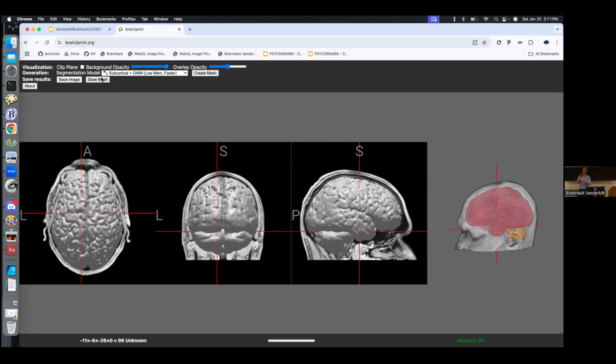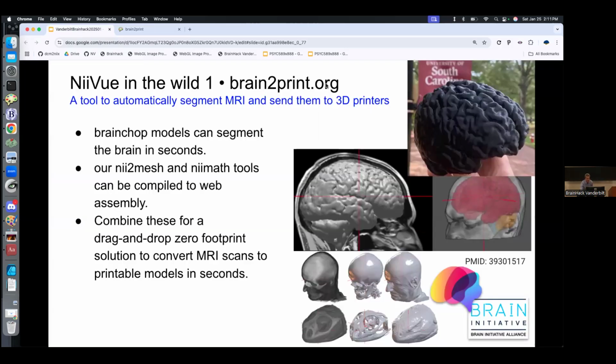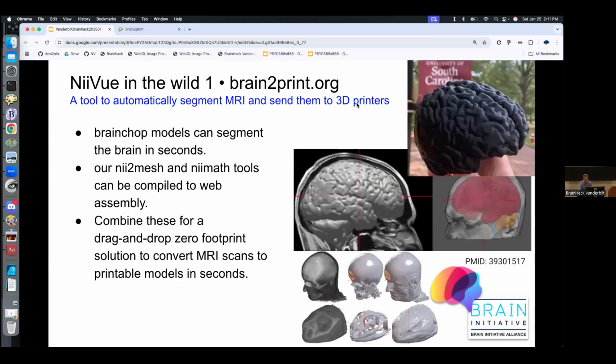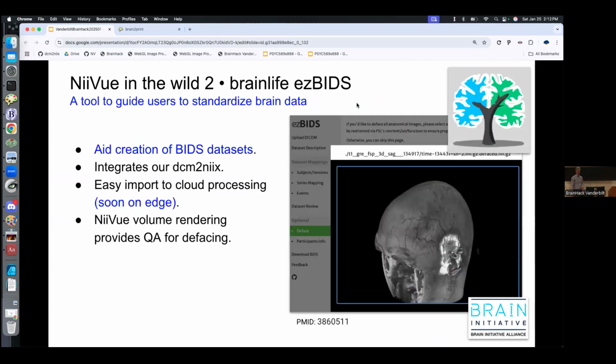So a nice example of an applet that shows you visualization that's interactive. You can deal with all of the different formats we do with it, and we can plug it in and look at different tools. So what I want to try to show for the next few slides is how we can use different applications.